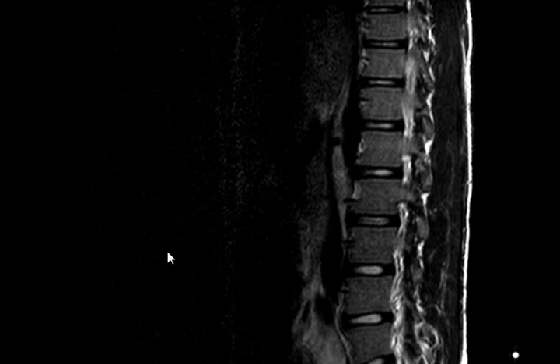Whether it's in the ovary, in the spinal cord, wherever. Anywhere. A lesion that is not purely fat, it's a dermoid cyst. Okay?